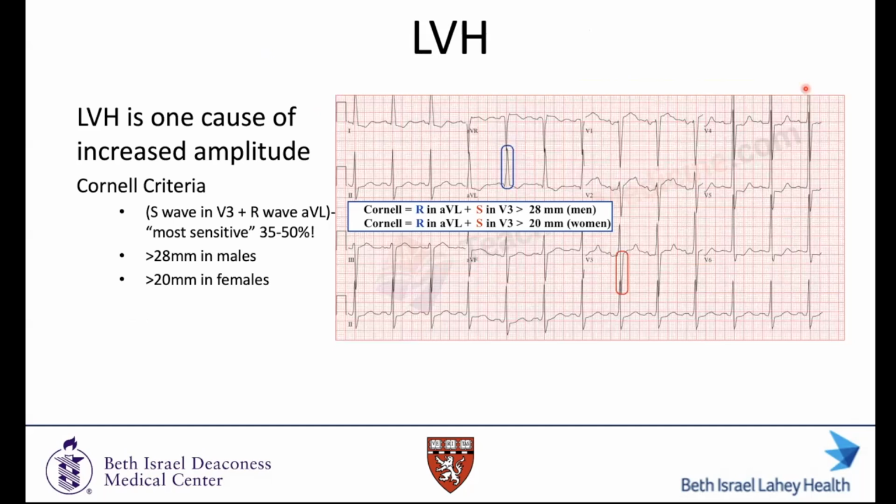most sensitive. So here you're adding the S wave in V3 with the R wave in aVL. And if it's greater than 28 in men and 20 in women, that's consistent with LVH. We'll have another session on LVH and RVH later on.